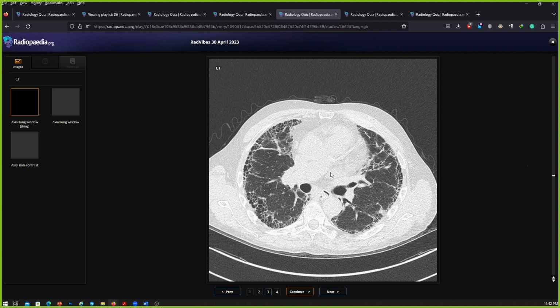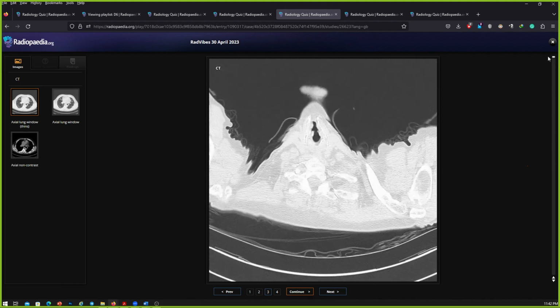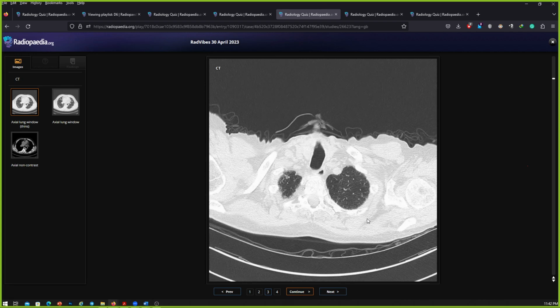Here is your CT scan. I will just scroll to the top. Please leave the mouse and then I will give you control. Now you're good to go. You can start scrolling and describe this particular CT. You can click once and start scrolling. Yes, now it started moving.